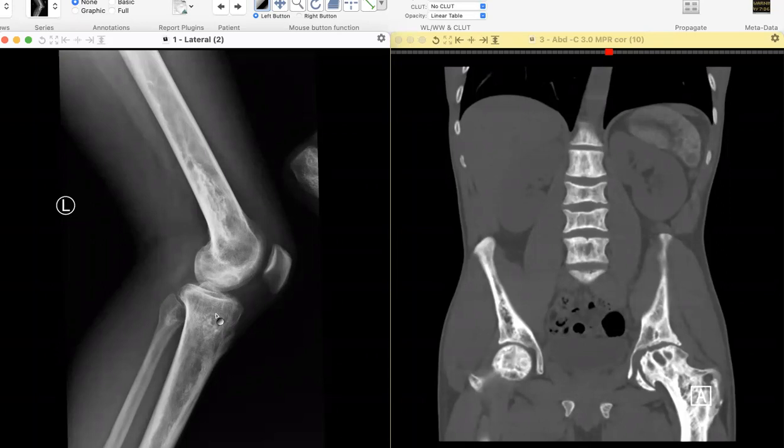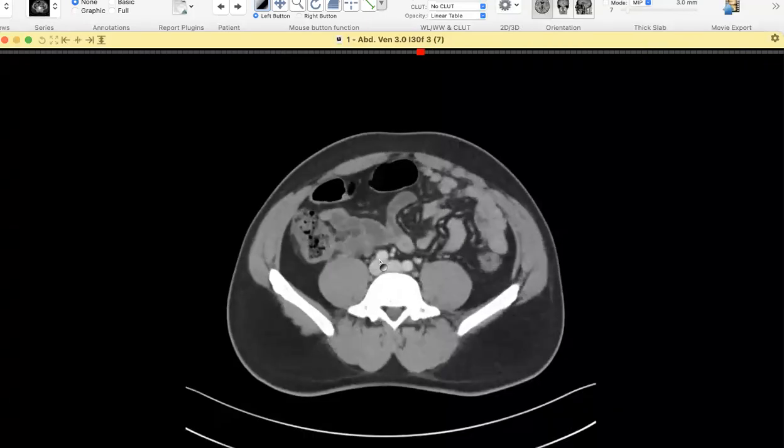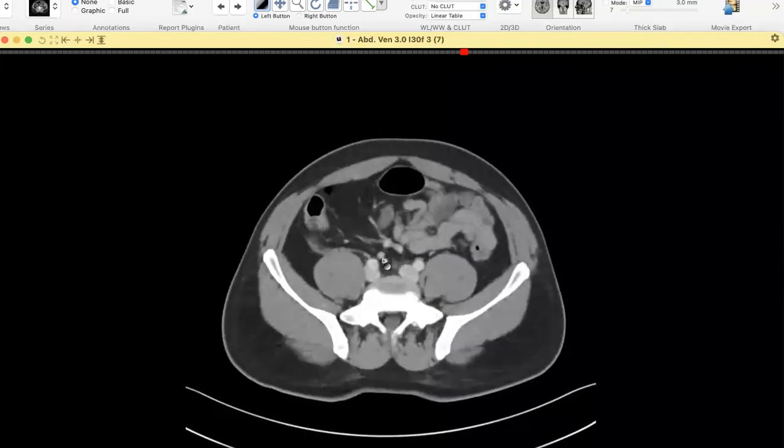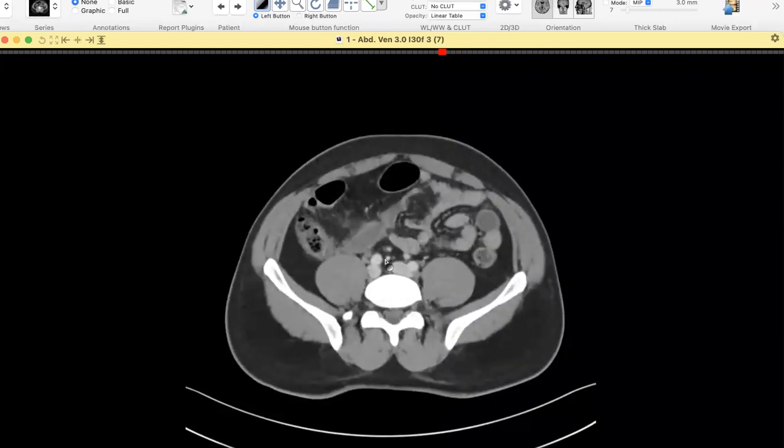Your next case. So straightforward, you went for mucocele, and I don't agree that there are inflammatory features that we are seeing, although there is some fluid. Dr. Wasif, we cannot see the image. Yeah, my bad. Okay, so more than 15 mm has a high correlation with mucocele.